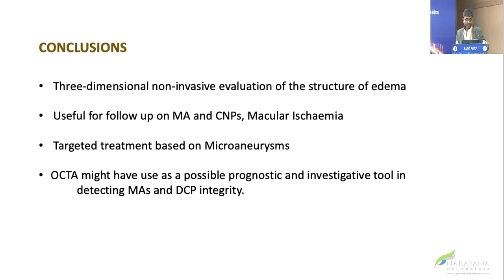So to conclude, it's a 3-dimensional non-invasive evaluation of the structure of the edema. Understanding, I believe it's in a routine practice. I just used to go back and see what's really happening there if there's a non-responding edema, or to rule out macular ischemia. You can even do targeted treatment based on aneurysms. For academic interest, you can see these aneurysms, so what really happens in the CNP areas.